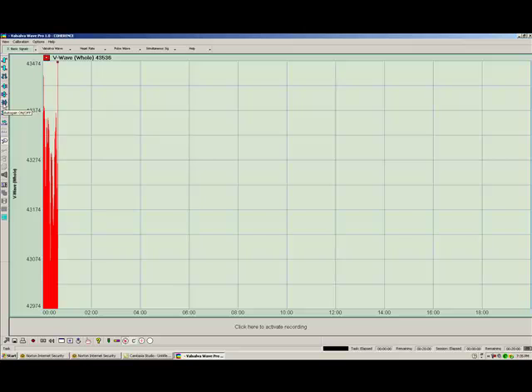Above that, we have the ability to turn auto gain on and off. Most of the screens are enabled to auto gain programmatically, and they will do that automatically in order to maximize the amplitude of the graph while fitting it on the screen. But this can be a little distracting at times, depending on what you're measuring and what the goal is.